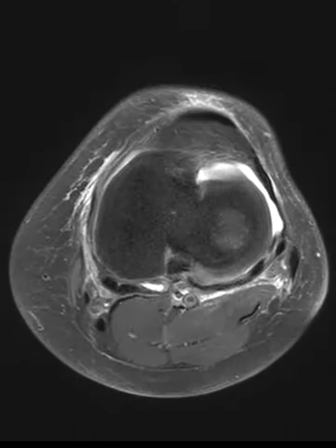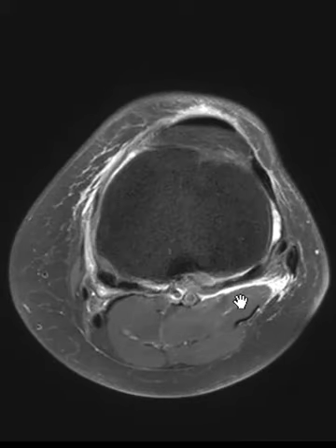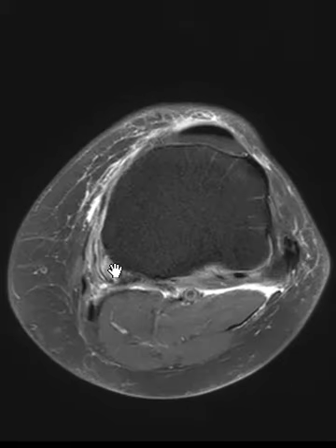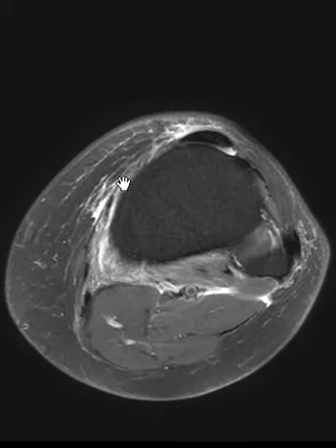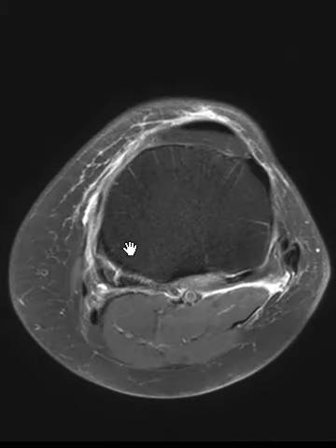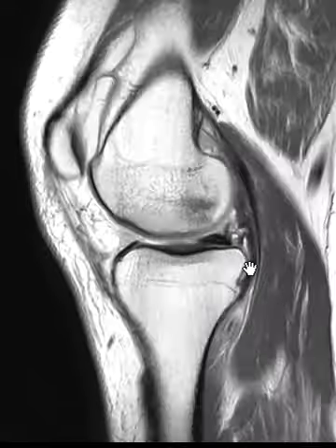We can see it even better if we look at the axial images. This is the semimembranosus. This is the medial posterior side. This is the gastrocnemius muscle, and there's that tendon. They touch each other here, and we can follow the semimembranosus down, and right there it starts to become too bright. And right there, really bright, it's almost fluid signal. So this is where it's partially torn from the tibia. They also had a sprain of the MCL and a low-grade injury of the pes anserine tendons out here as well.